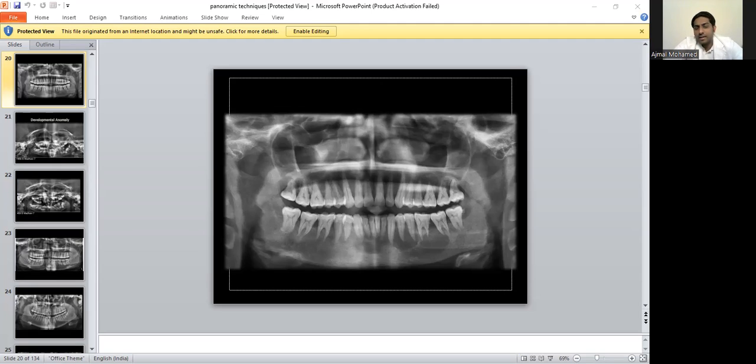Different types of rotation centers are there: double rotation, triple rotation, and moving rotation. The rotation center also changes as the components rotate, because it allows us to image and conform to the proper elliptical shape of our dental arches.